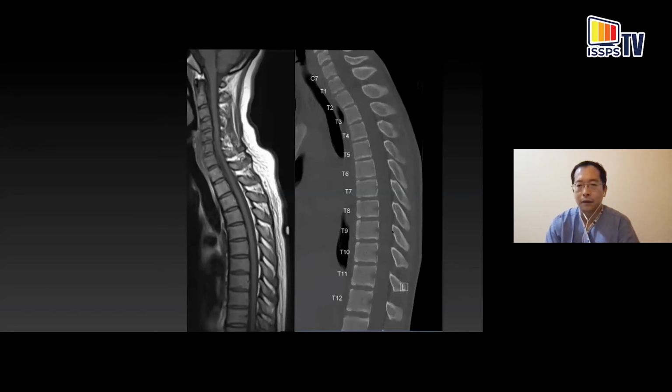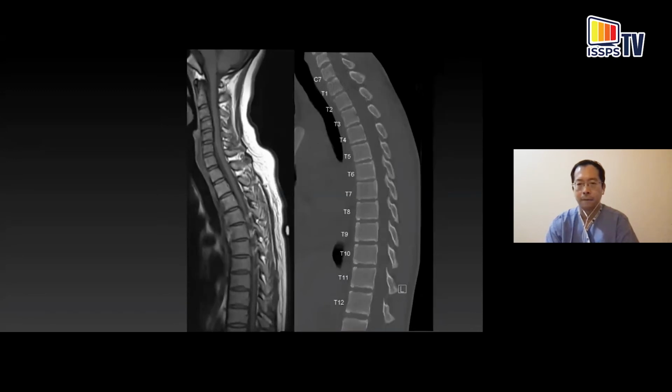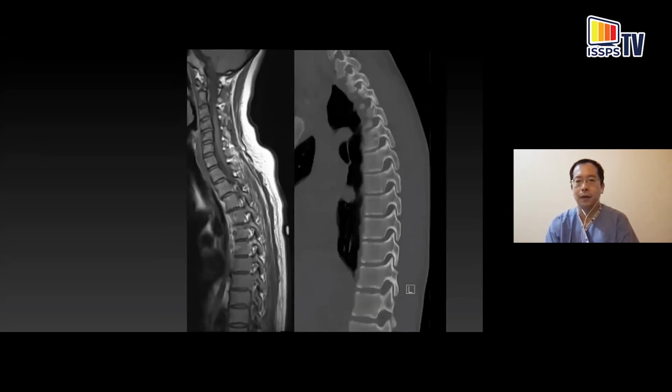And then it starts to flare out a little bit in the lower part of the thoracic spine. Similar for the interlaminar space, you've got a bit more working space down here in the lower thoracic spine. Over here, very crowded. And then as you move upwards again, slightly more space to work with in the upper part.